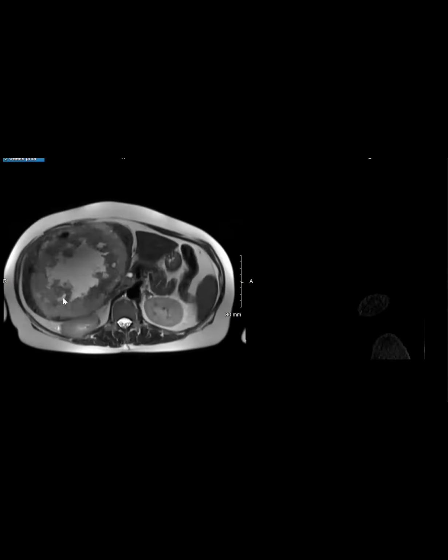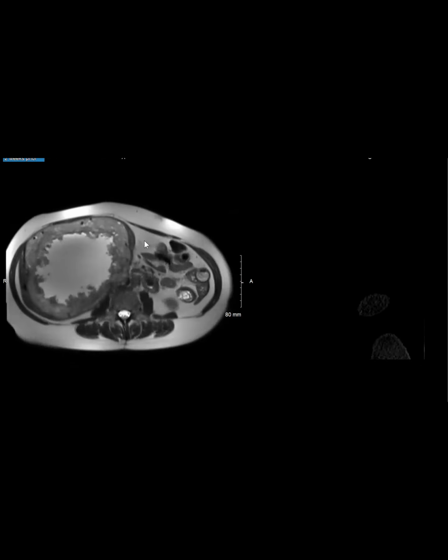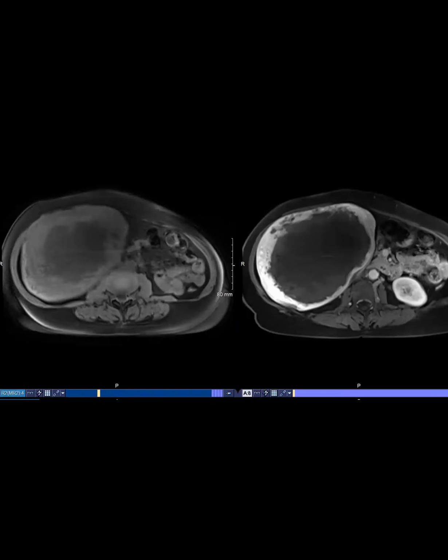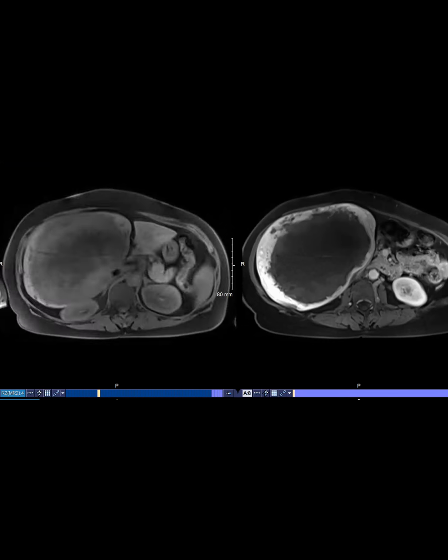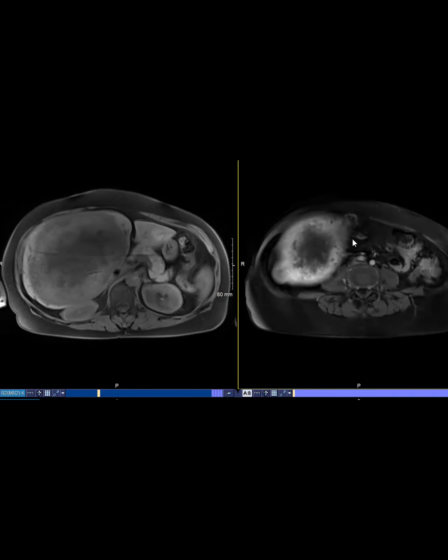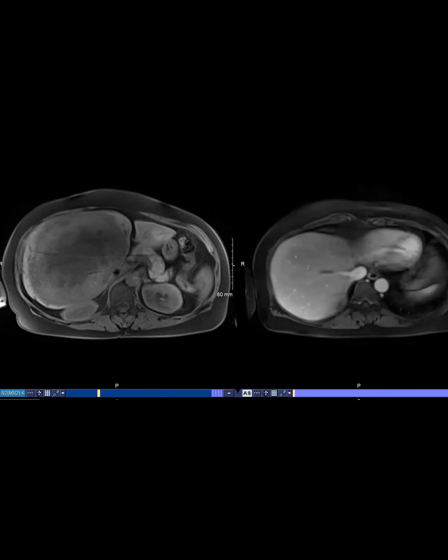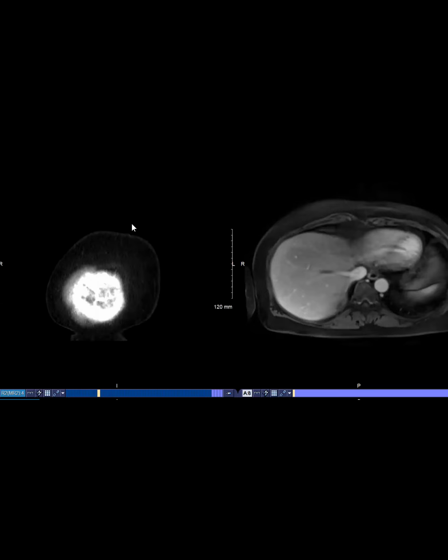They did an MR a few days later. You can see, again, very irregular central necrosis, kind of irregular peripheral enhancement. So obviously here we're thinking about neoplasm first and foremost. Sorry about all the noise, I'm in the reading room. Anyway, in these cases, patients need to have pathology. So this was an atypical solitary fibrous tumor of the liver, which is something I've never seen before or since.